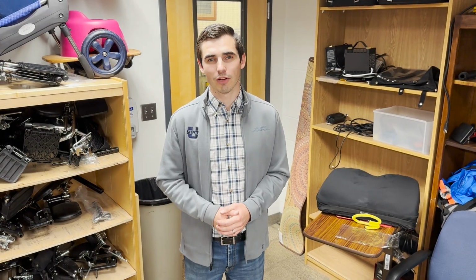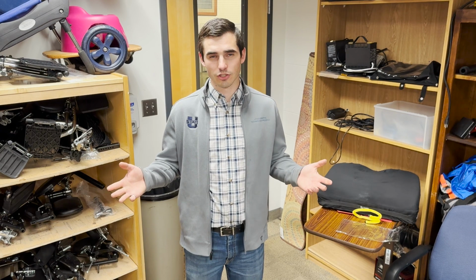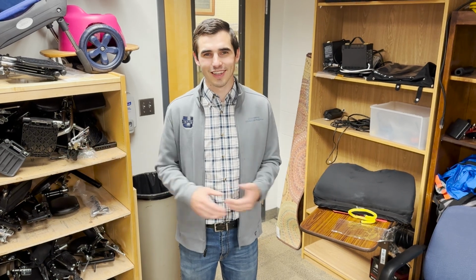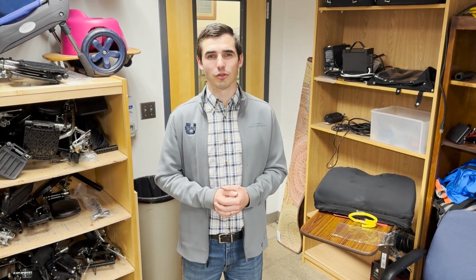Welcome. Today we're going to be covering mobility devices, manual and power wheelchairs. We hope that this session is informative for you. I know when I first started, I just thought a wheelchair is a wheelchair, right? And I found out that's not true at all. So hope that you can gain something out of this that can be useful.